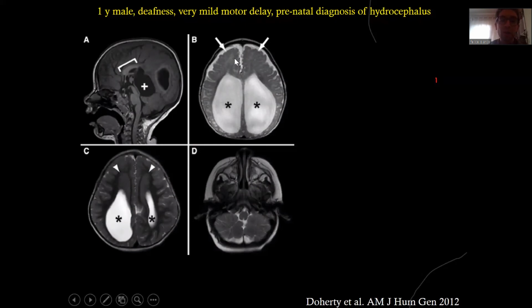There is polymicrogyria here. Look at the normal cortex here in this unmyelinated brain that suddenly becomes very lumpy, bumpy, very crowded here. This is polymicrogyria. But not only polymicrogyria, there is also something here along the ventricle anteriorly that is abnormal gray matter. We call this periventricular nodular heterotopia.